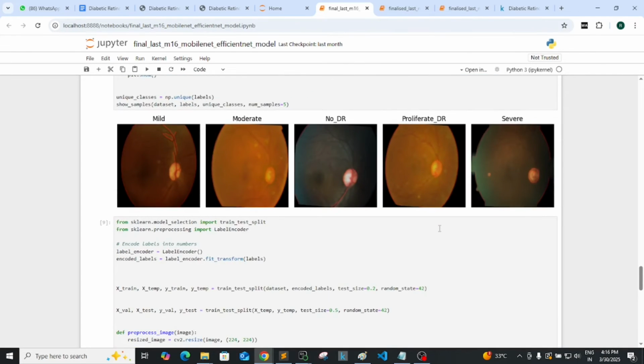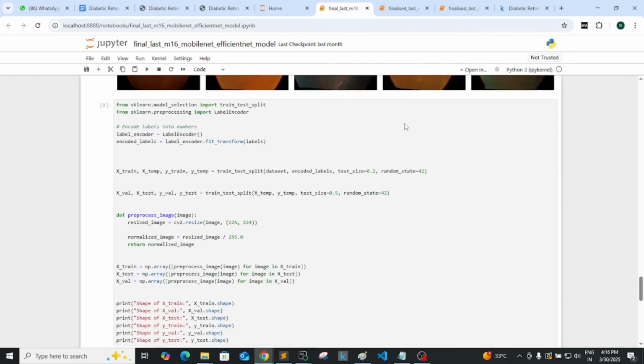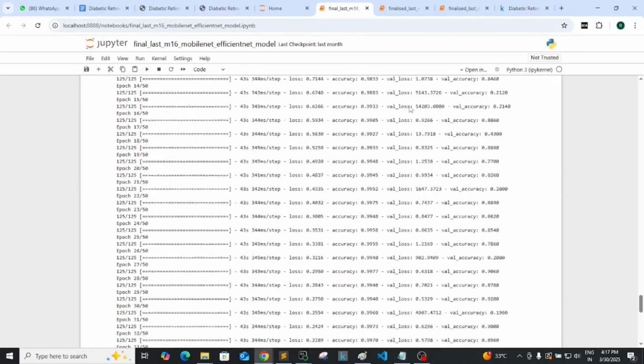After balancing, we apply a combination of filters. By applying the combination of filters, even though these are 3D-like images, the regions are highlighted with red colors. The visible lines are highlighted in red. After that, we split our datasets and then build our model.